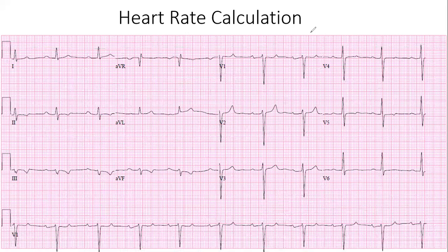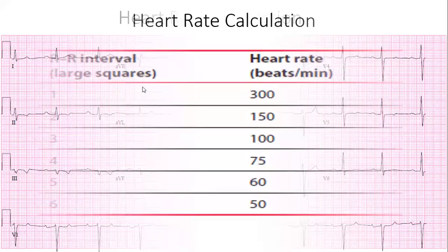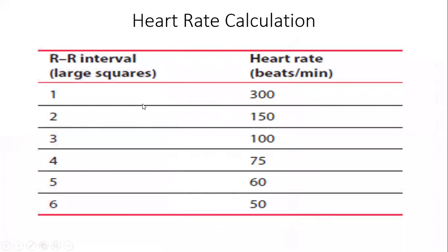So the second method that I'm going to show you is this one. Now, with this one, there are 2 options. One, you can either memorize these numbers, where you look at your RR intervals.